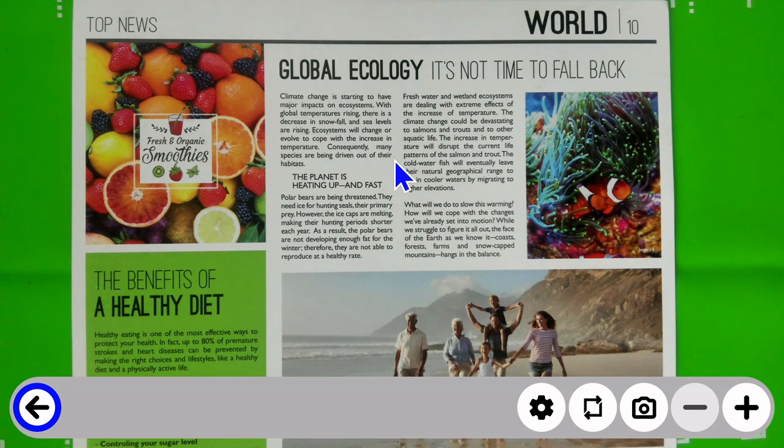It will come online with my HoverCam Solo 8 and I see a document placed underneath of it. At the bottom of the screen is a toolbar with different items that we're going to explore in this video. In the bottom far left, circled in blue, is a back arrow. If I were to tap on this, I would return to the carousel where we were just a moment ago.